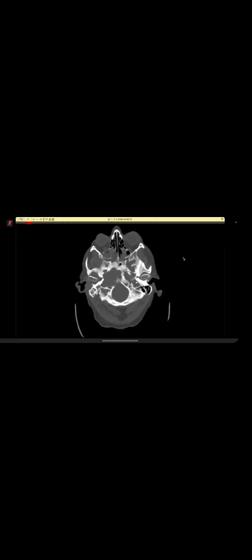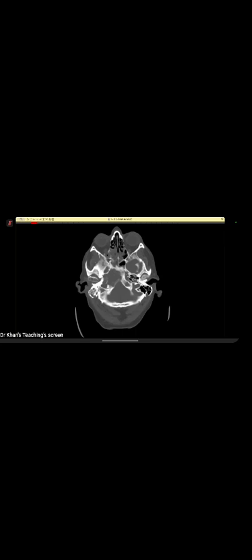Okay, so there is again extensive erosion of the... Show me the epicenter. What do you think is the epicenter of the lesion? It's the right side of the sphenoid basal occiput, sorry, and the clivus. Where is the extending, where is the petrous apex? Compare. And the petrous apex also. It's invading the right petrous apex.